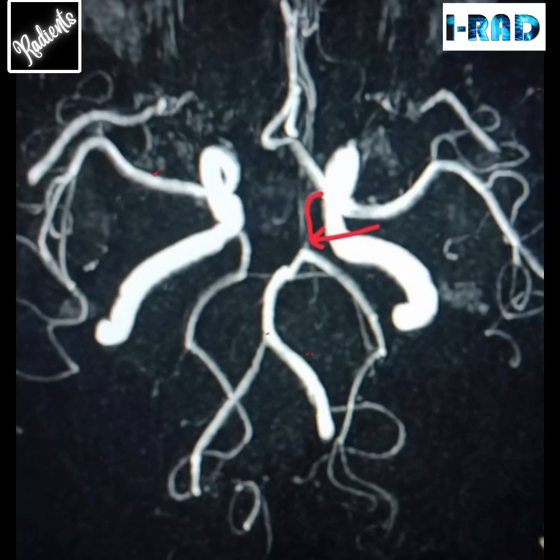And this large artery is the PCA. So this is the PCOM on the left side and this is the left PCA. However, on the right side, I cannot clearly visualize the P1 segment.